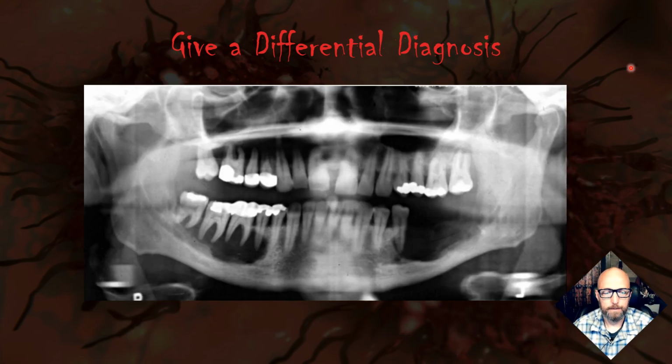All right, what about this one? Probably getting a little bit ahead of myself with this case because I talk about this one more in the multifocal lecture, but I did mention this as one of the 3 L's. This is Langerhans cell histiocytosis. And how do we distinguish that from the previous case? Does that look just like a typical periodontitis? What's different about it? Maybe you'll appreciate this scooped out appearance. Periodontitis does not do that. It doesn't undercut the alveolar crest.